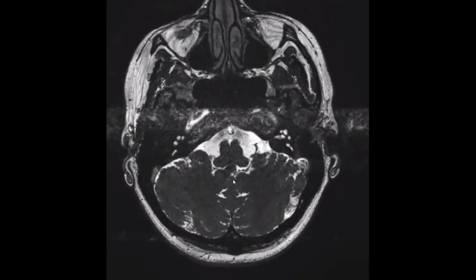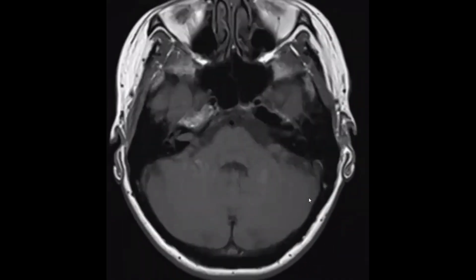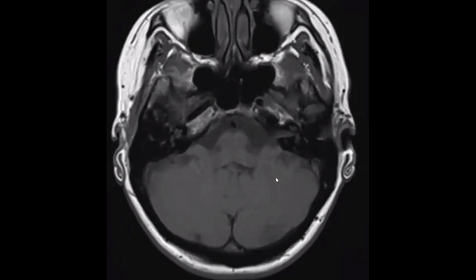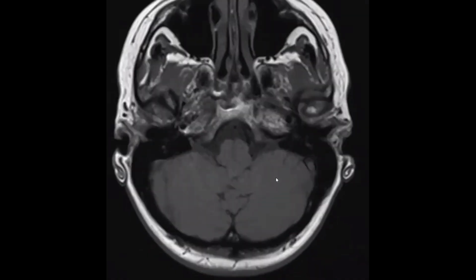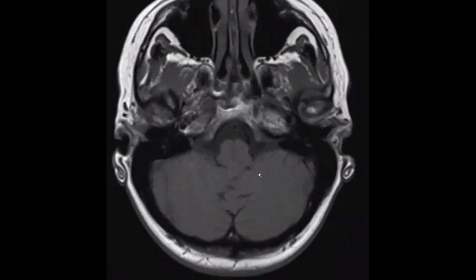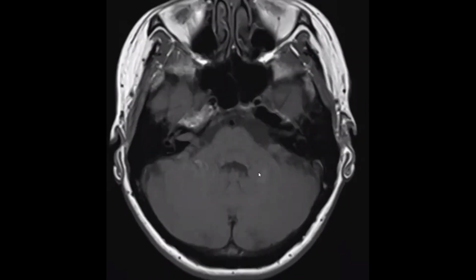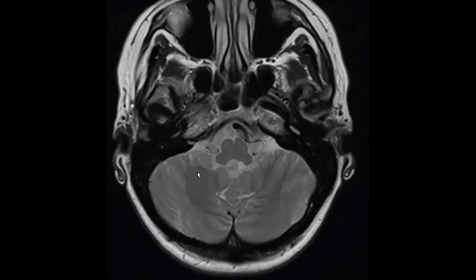This looks like a dolichoectatic vertebral artery, but there is also a right-sided small lesion at the right intracanalicular portion. There is a mass in the right intracanalicular portion of the internal auditory canal, creeping over the vestibulocochlear and facial nerves. So this could be a vestibulocochlear or facial schwannoma, a right-sided acoustic neuroma. What else? Do you have any more abnormalities?